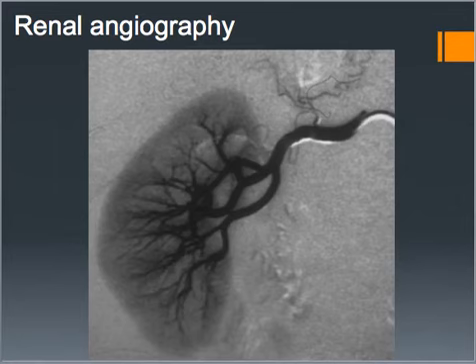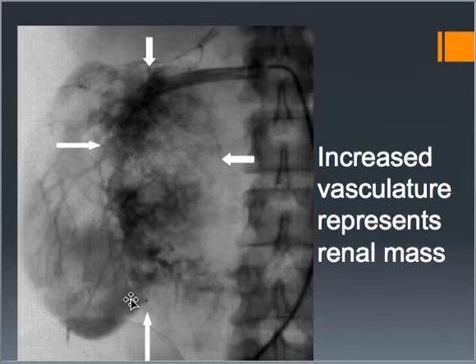So this is a renal angiogram, angiography. You can see here is the outline of the kidney, right? And then you've got all of the blood vessels going into the kidney and the arteries. What they're looking for usually is a rupture or a blockage or any kind of disease, like the possibility of a tumor. Renal ruptures are usually pretty rare, but I'll show you one in just a couple slides.